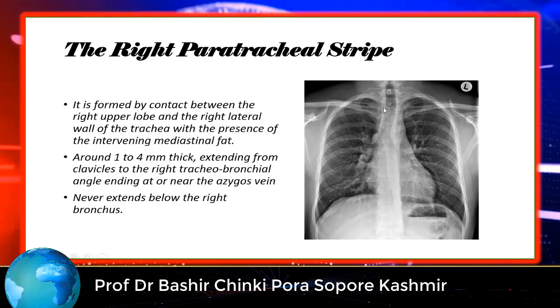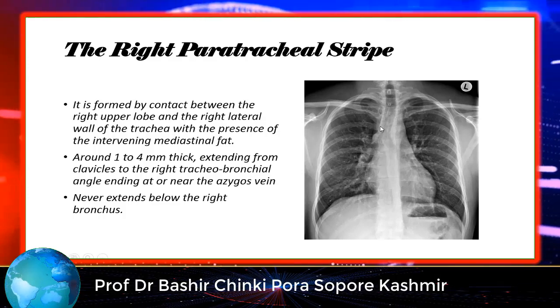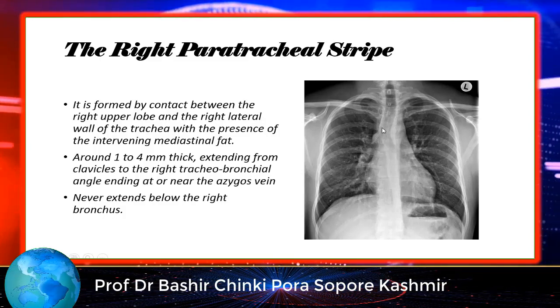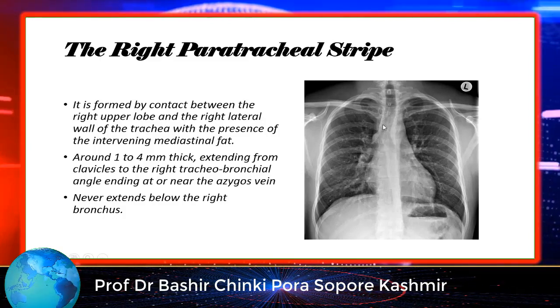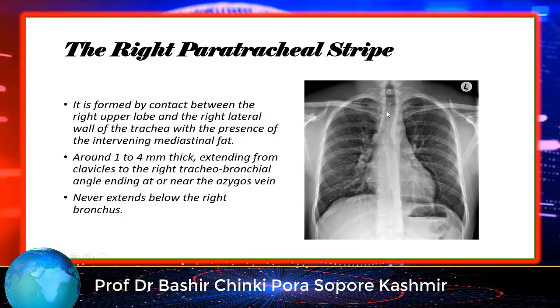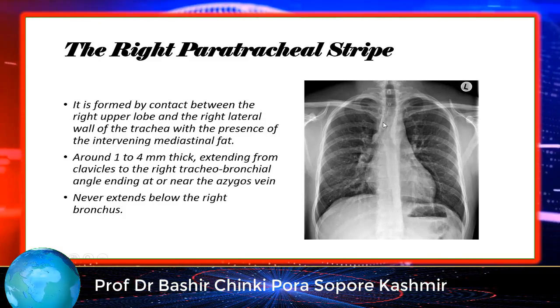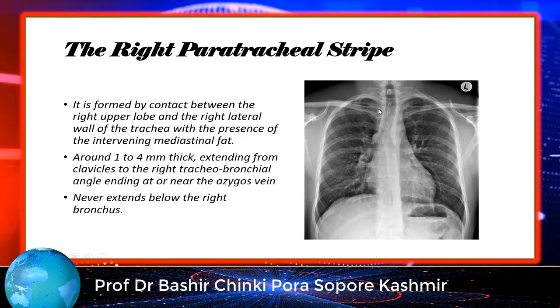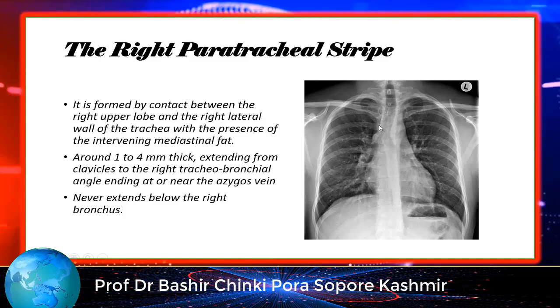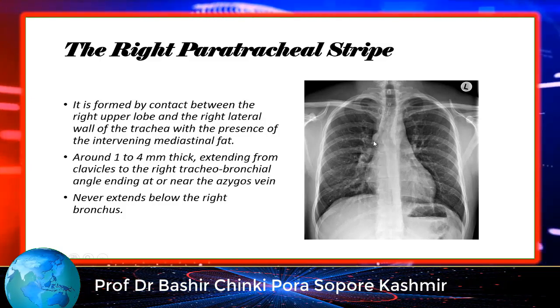So this forms a vertical opacity or line, around 1 to 4 mm in thickness, and it extends from the clavicles to the right tracheobronchial angle.